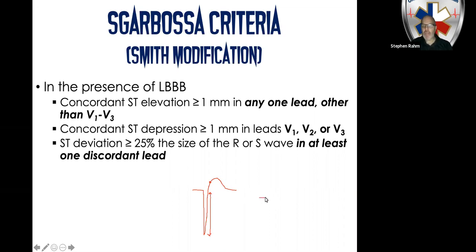In contrast to an S wave that's not that deep and an ST segment that may only be elevated by 2 or 3 millimeters. So now, I'm sorry, this is a crappy drawing here, I'll put my J point about right here.